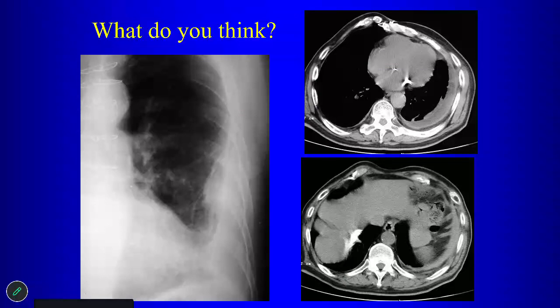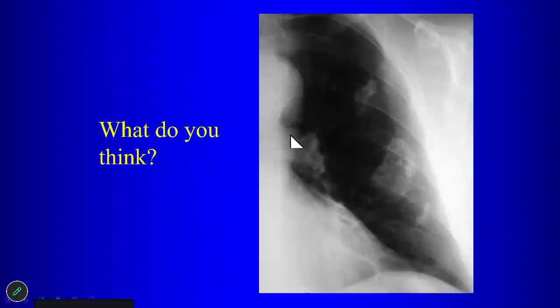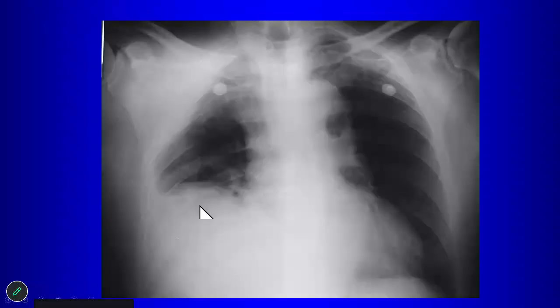Right. So that can give you pleural thickening. It can give you pleural effusion. Certainly, in somebody who has asbestos exposure, you want to make sure that you're not dealing with mesothelioma, but you can have pleural effusions and pleural thickening just associated with asbestos exposure. These pleural plaques are also very common with asbestos exposure. You can have this en face appearance. Sometimes they look like leaves, they have a holly leaf sign, when you look at these en face.